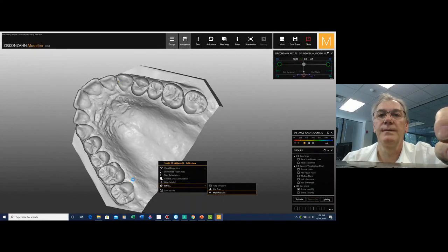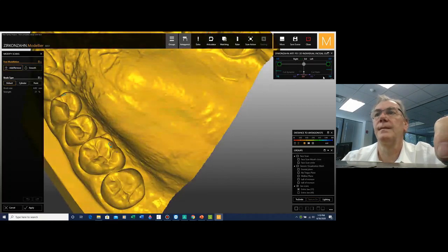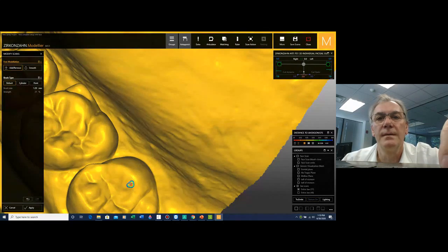Come on. And here we are. Shake this cusp a little bit.